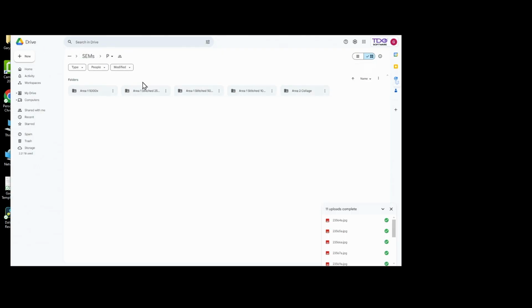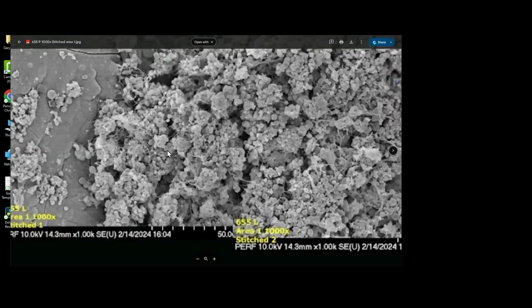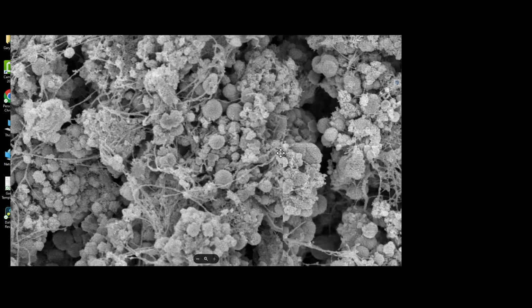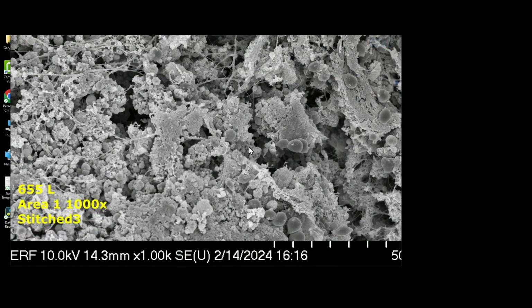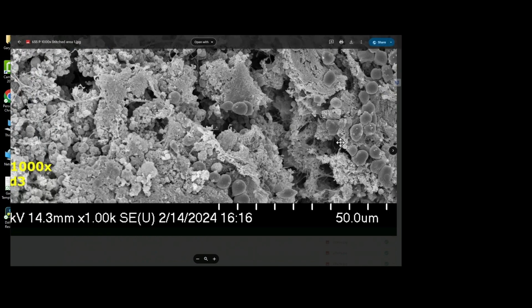And here you can see kind of a standard demineralization taking place in the predentin. So the predentin hasn't been completely removed here. And to me, those look like odontoblastic cell bodies.